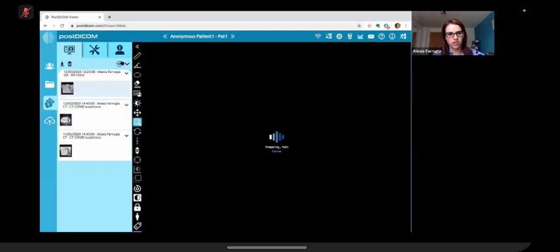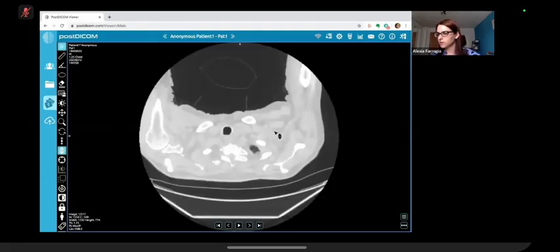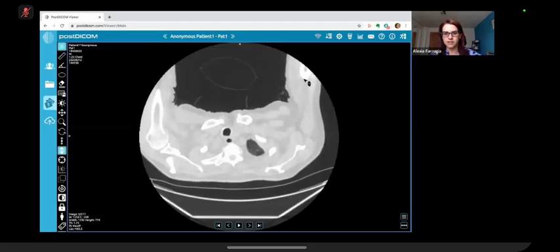I will show you the axials to start with. Okay, so I'm going to scroll through, focusing on the lungs.